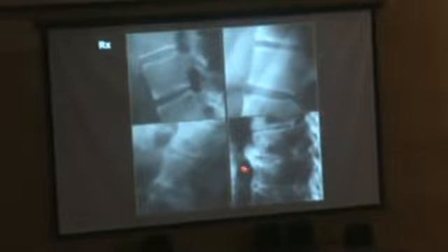Another later stage. Now, yes, we can see a very nice syndesmophyte anteriorly, just like here. And sometimes syndesmophytes can be large and irregular, like this one. This is less common with ankylosing spondylitis, but more common with other spondyloarthropathies, and I will show you some examples later.